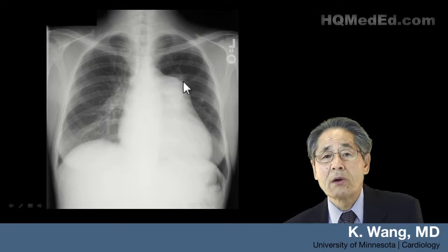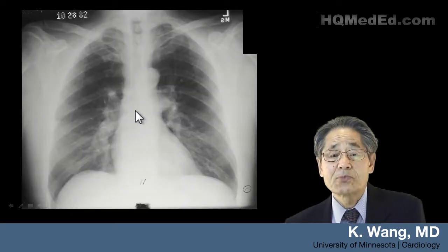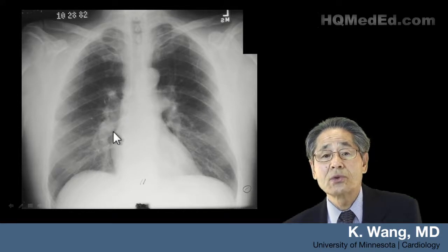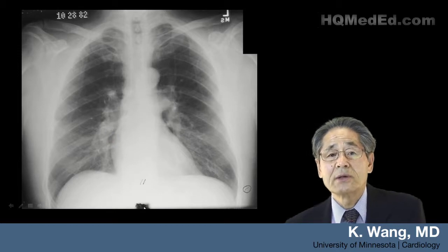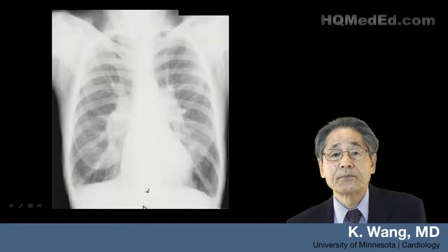This big bulge is actually a dilated pulmonary trunk, and it may be a reflection of primary pulmonary hypertension, or like in this patient, the caliber of the pulmonary artery, right and left, is too big, another example of a manifestation of pulmonary hypertension.